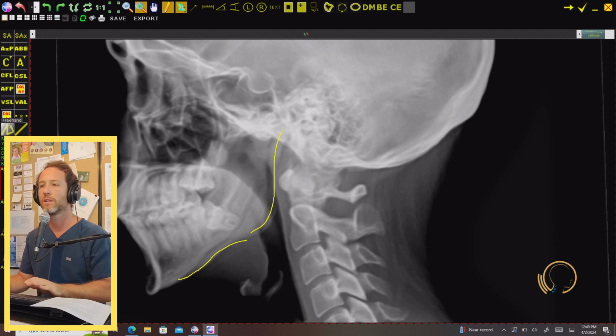And then, you could potentially have the skull completely perfect on here and have these be off as well, which is worth mentioning because you could have trauma to this jaw. So how would you reference that? Well, you'd look at your ocular orbits. So if everything is perfectly aligned, kind of giving you some reference to look at here. Like, let's say these ocular orbits are superimposed. Well, let's say they're not. Let's say one's staggered, anterior and posterior or superior, inferior. That will give you information when you're even assessing if this is a credible view to take and measure on. But that would be sort of your setup.